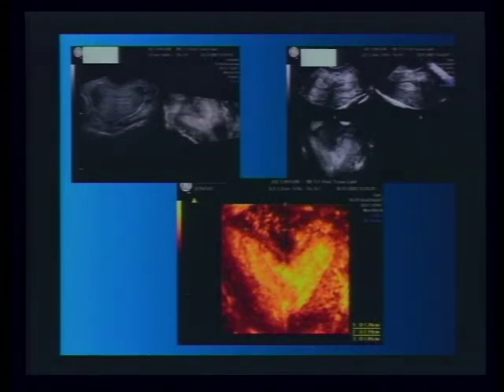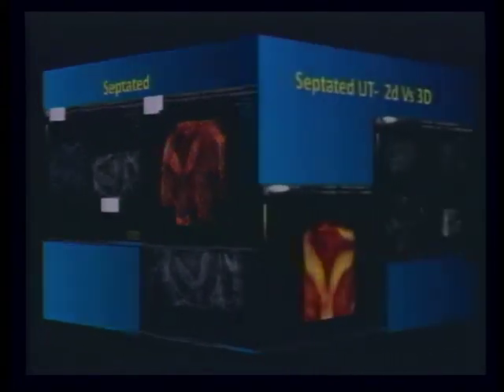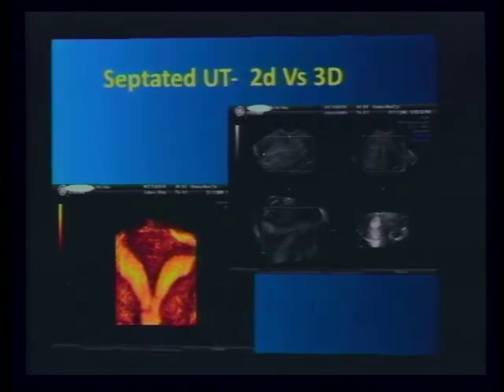You can measure the dimension of the septum and deliver the patient to the hysteroscopist. Other examples of a very large septum. Here, the two-dimensional versus the three-dimensional ultrasound showing the septated uterus.